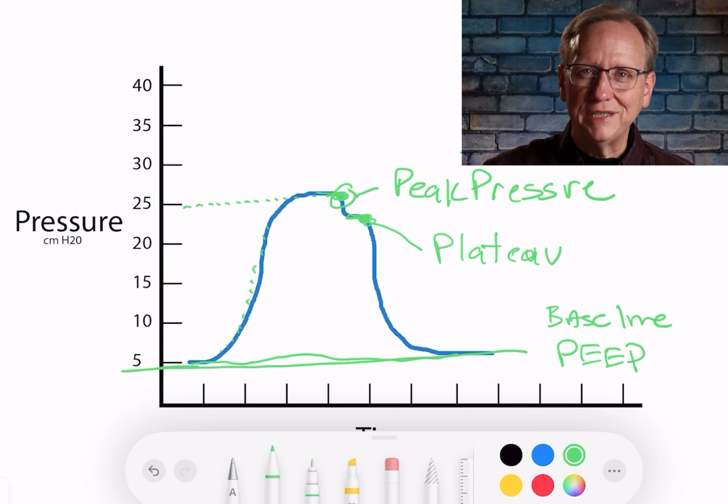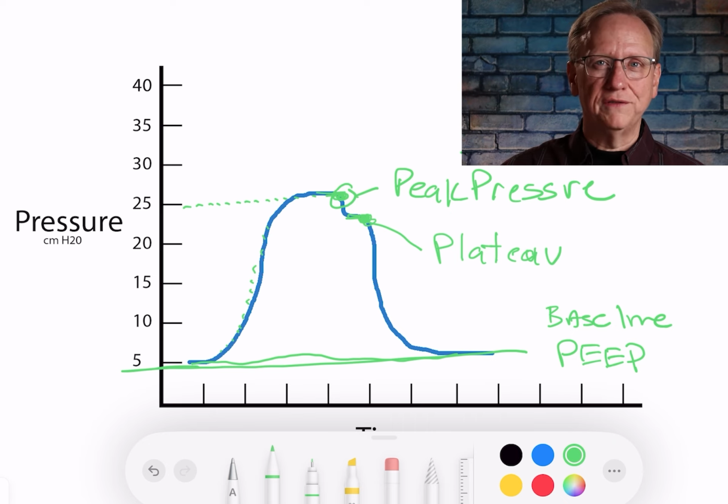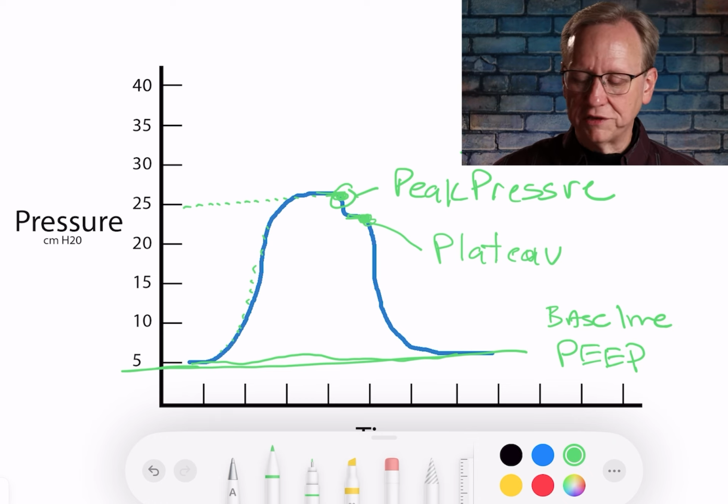That's why I said originally, if you're walking into a patient's room, you probably don't have an inspiratory pause. It's kind of uncommon these days to use that. It increases mean airway pressure, so we're worried about that. But if you do see that, then that's because you've dialed in an inspiratory pause. And sometimes we'll dial in that pause just for a few seconds so that we can see what their plateau pressure is, and then we can analyze this graphic for that. But that's what's important there.